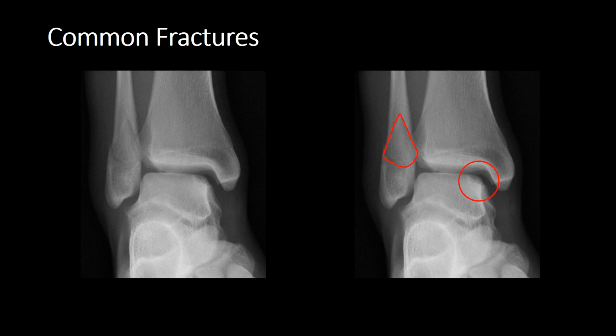Basically, this person has sustained trauma in the past. And what the most likely belief these days is that they have sustained an osteochondral fracture, and that osteochondral fracture hasn't healed properly. And when I say it hasn't healed properly, it hasn't actually stuck back on to the talar dome. And what happens is that you have this defect, and we can see that defect because there's increased lucency, because there's not as much bone density, because you have a piece of bone missing.